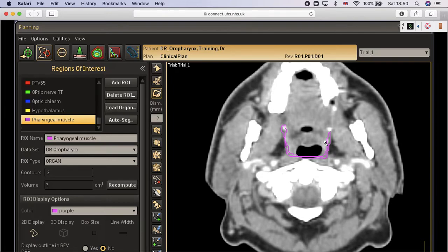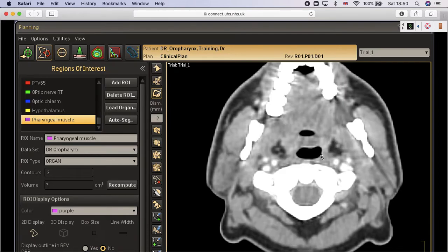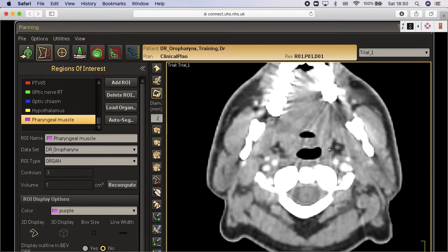Don't draw the next slice, okay? Just go down. What will happen is the pharyngeal wall will start to be V-shaped. So can you see this wall here? So look at this. What's happening now? Look, look. So the pharyngeal wall started to be a V shape. Yeah, can you see that? Again, we are not drawing the, oh, sorry for that. Yeah, this is my planning system again. So 2 millimeter thickness, if your planning system can help you and stay at 2 millimeter thickness, you will take the mucosa. No way you can separate the muscle from the mucosa.